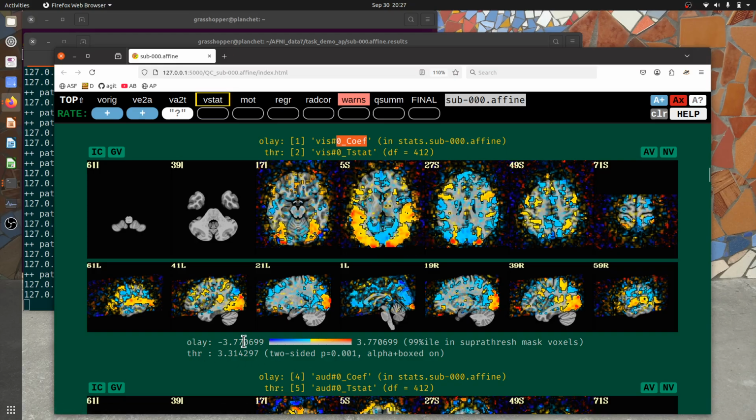And we see here in our color bar that the min and max for what we're looking at here is plus or minus 3 or 4. So this means that where I see red here, this is about positive 3% change. Dark blue is about negative 3% or so. And so we see meaningful information by displaying with the coloration the BOLD percent effect from this meaningful scaling to BOLD percent signal change.